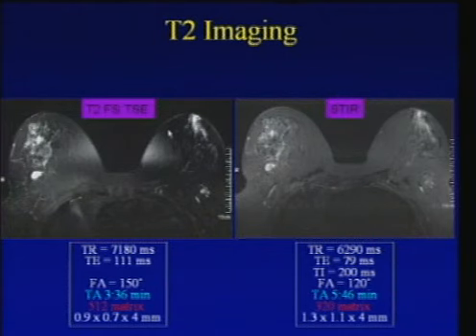You're going to try to see, in fact, if this holds up in all three planes, in the sagittal, axial, and coronal planes. This is just to show you in general, I prefer to do T2 imaging on a 3T. STIR, I think of as a little bit more of a general body sequence, and I find that you have improved image contrast with a T2. Another benefit is that even if we are using a higher resolution with a 512 matrix, because you're using T2 imaging, you actually have a shorter acquisition time.